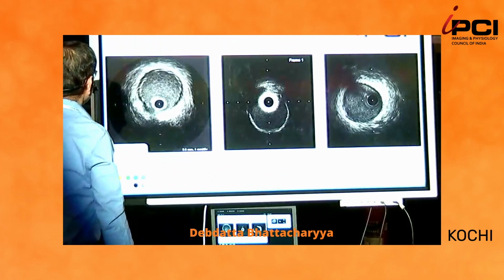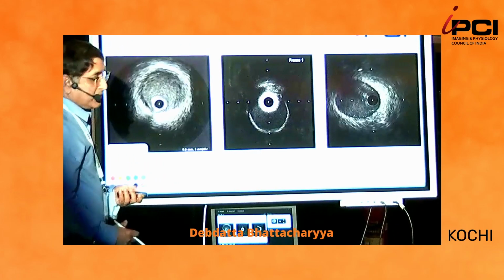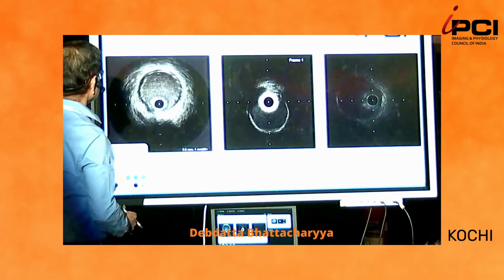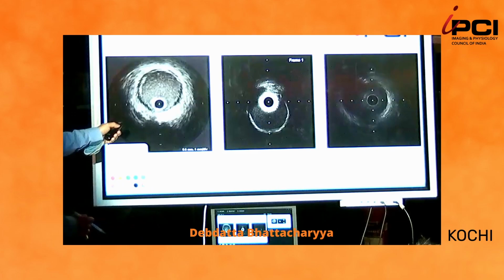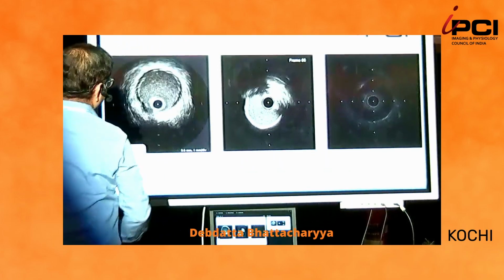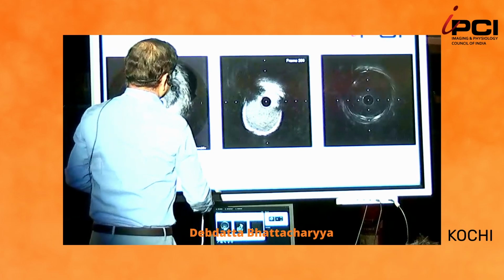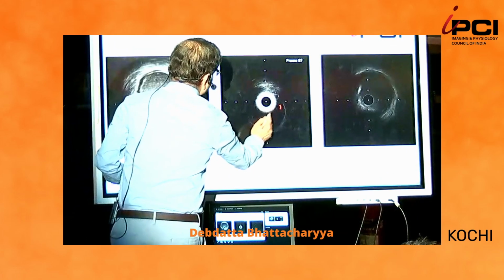And you have heard about rotational catheters and how you have to flush them free of all air. Otherwise, you can get bad images. So this is the normal artery again on your left, and these are two images. In this image, as you start, you cannot see anything.